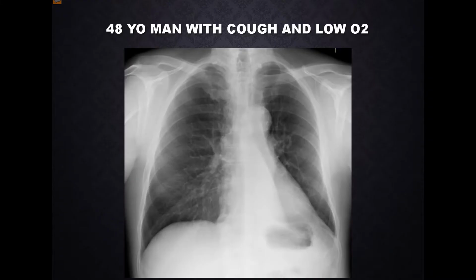So this patient has got a cough and is desaturating. Is it normal? No? Shaking your head? Where's the abnormality? Left, right? Sorry, right? Did someone say right?